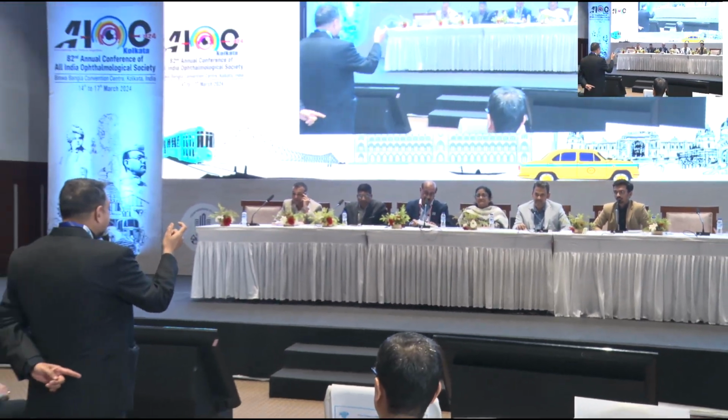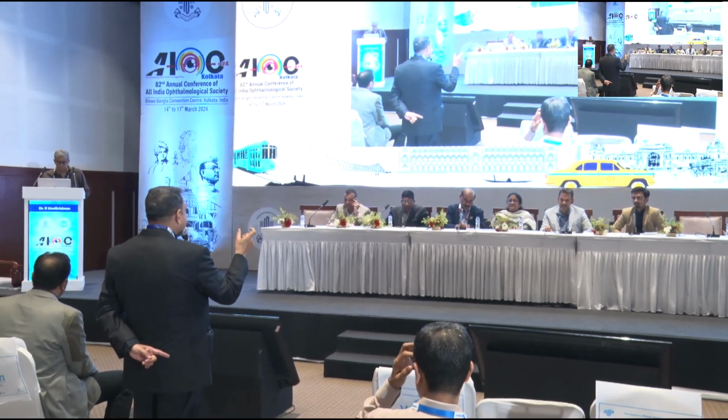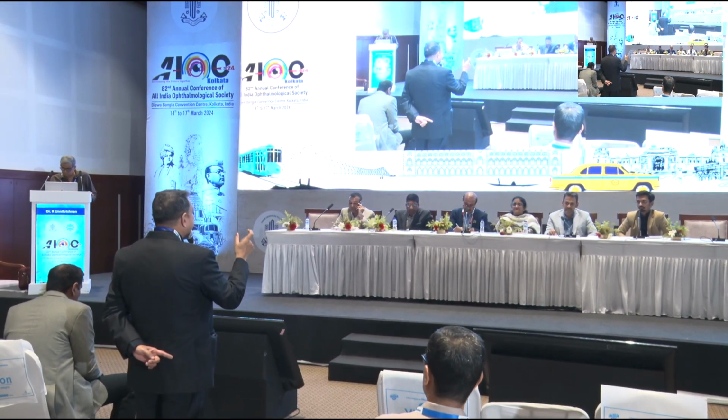No. See, the very point of OCT in recurrence is that you are capturing it earlier than the fluid production. You have that window of opportunity to prevent further damage. So I believe in future, TAE is going to change to OCTA guided TAE.